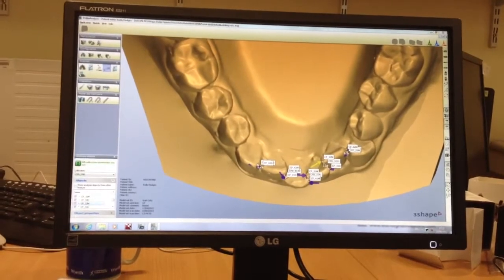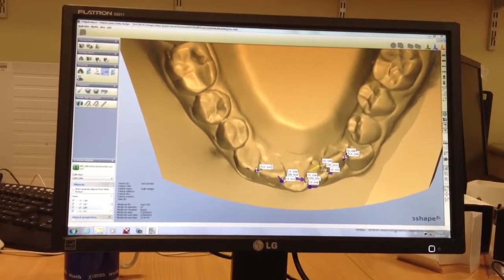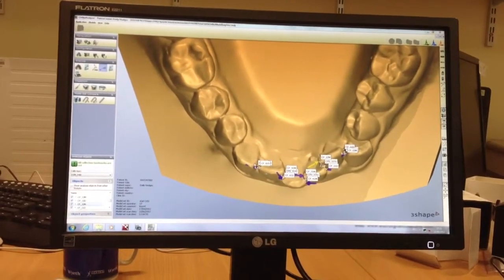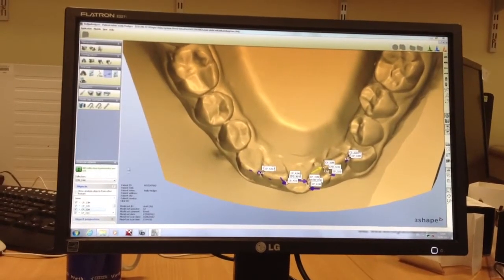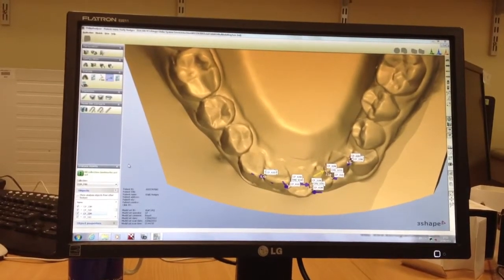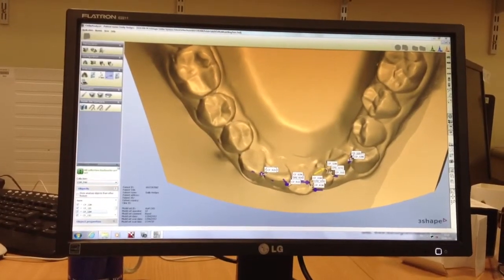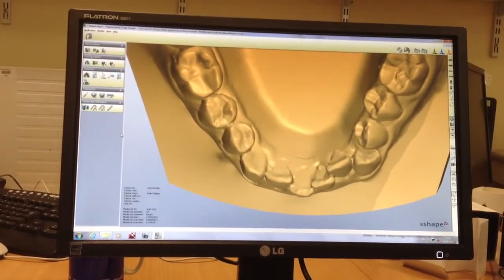How would I record an impaction? Because that's usually 5 points, isn't it, for an impaction? Yes. I think we have an option in the questionnaire that we would check the box for an impacted tooth. Okay. Yeah, that's it. So once we've selected all those points, we can just close that window out.